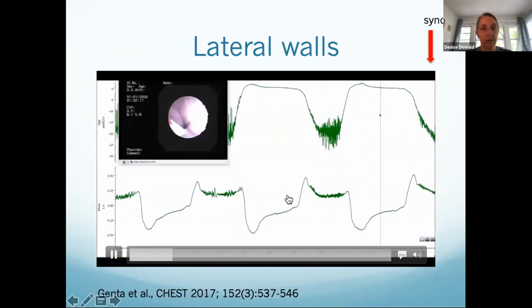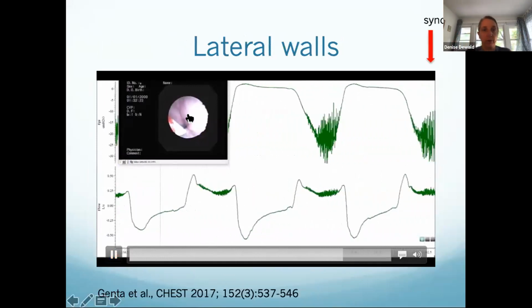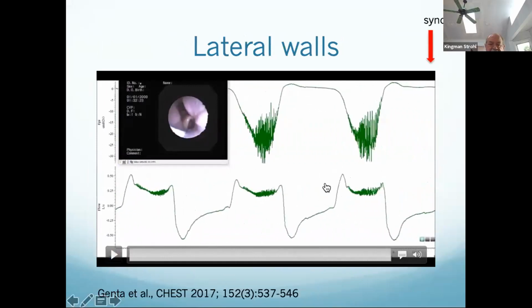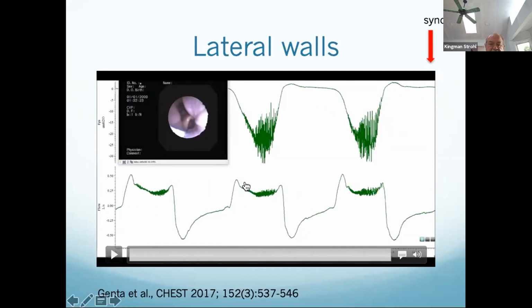Here we go. This is a faster one. So you see the airway walls, they're sucking in. You see that little dip at the end of inspiration too? The little thing that goes up there, Zach? Zach, you see that? And Maduri, you see that? Yes. Now you don't usually see that in the flow signal.